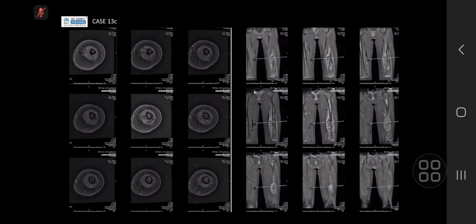Good. I'm just showing you some axial imaging, that extensive periosteal reaction, the extraosseous soft tissue, and you can see some post-contrast imaging there as well. So this is the most common malignant primary bone tumor in children, osteosarcoma. And then you have the less common subtypes, and we've mentioned one before, the telangiectatic, etc. These are aggressive metaphyseal and metadiaphyseal lesions.